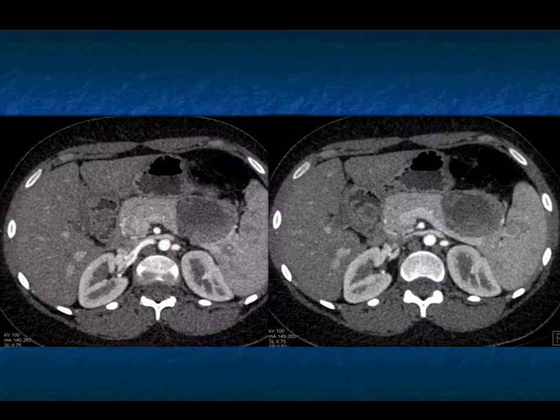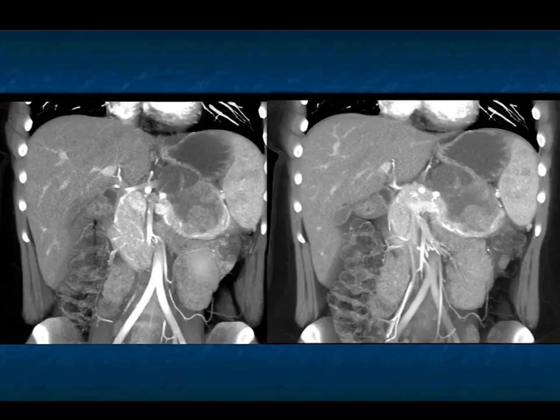When you start seeing a cystic lesion like this one with nodularity, I'm always worried about malignancy. I would be really worried, particularly if the patient's a bit older, of a SPEN tumor, or rather an MCN, with SPEN being considered. I don't like this for a serous cystadenoma. I'm worried this, with the soft tissue component, would be malignant. And this ended up being a SPEN tumor.